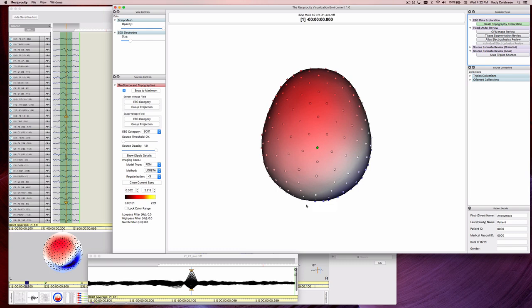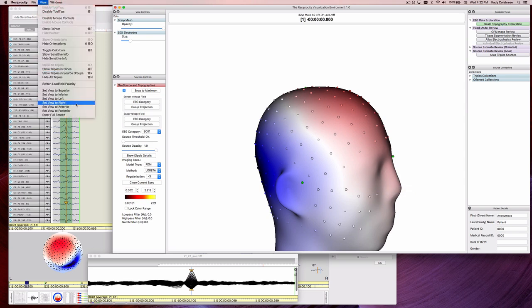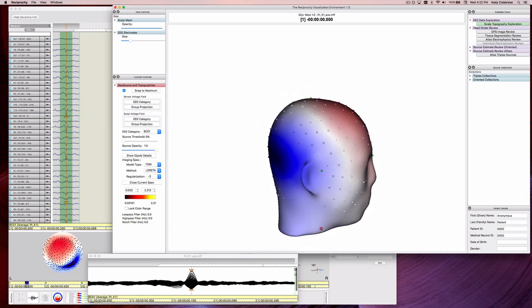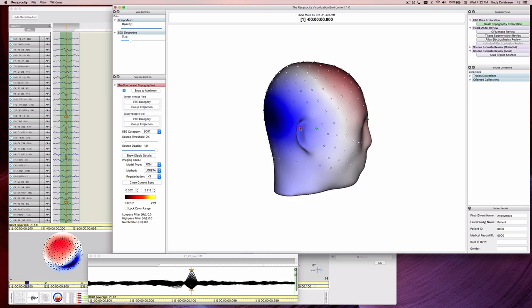Use the 3D topo map to assess your data and further your understanding of the data in the 3D space. Hold down the left click button and drag to view different sides of the 3D topo map. Click on View in the toolbar to use different default controls to change the viewing angle. You can zoom in and out by holding down the right click button and dragging the mouse. You can move the images on the screen by holding the right click button and the Shift key and then dragging the image.